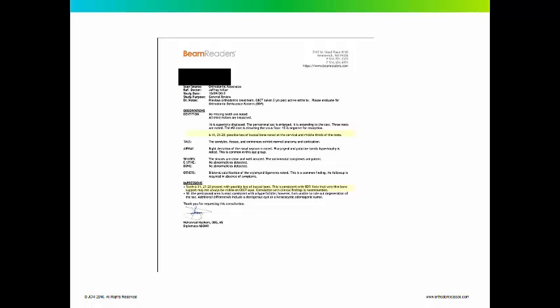But does that change the clinical significance of what was done here? I mean, whether you think this was the right way to treat this case or not, I think if you evaluate this case using a PAN and a Ceph, you're going to come up with a completely different conclusion than if you use a cone beam CT to evaluate your final results.